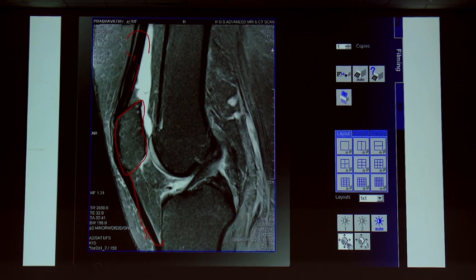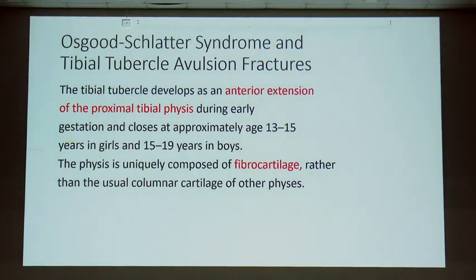One important point I want to emphasize. Patella alta simply by seeing the trochlear cartilage. You can see the trochlear cartilage here, and you can see the patellar articular surface. At least 1/3 of patella should articulate with trochlea. If it is not there, if it is going above, confidently you can say it is patella alta. If it is coming down, it means patella baja. The simple rule, it is not the Insall-Salvati ratio, other ratios, everything. This is 1/3 of your patella should articulate with the trochlear cartilage. This is a simple rule in sagittal. You can work it out whether it is patella alta or not.